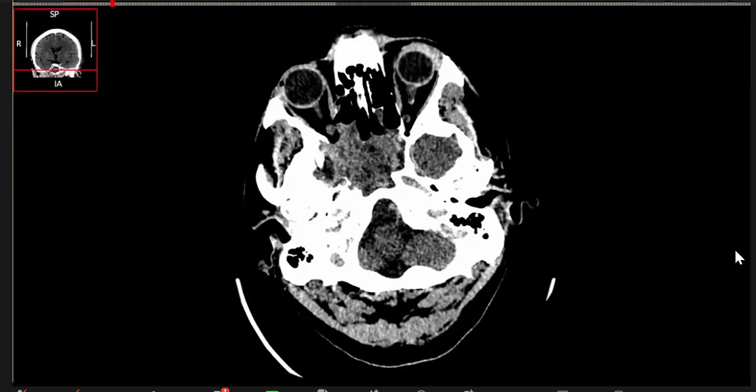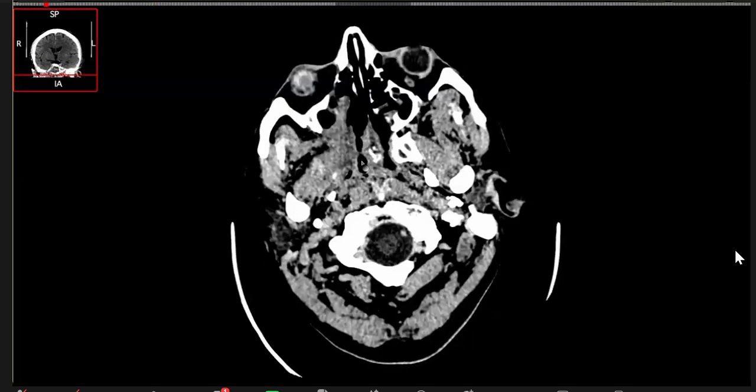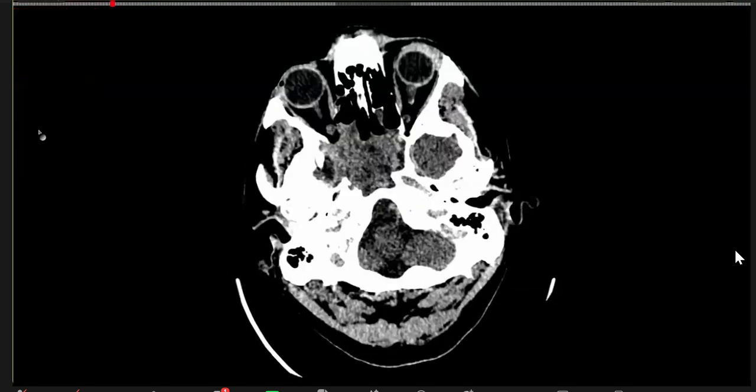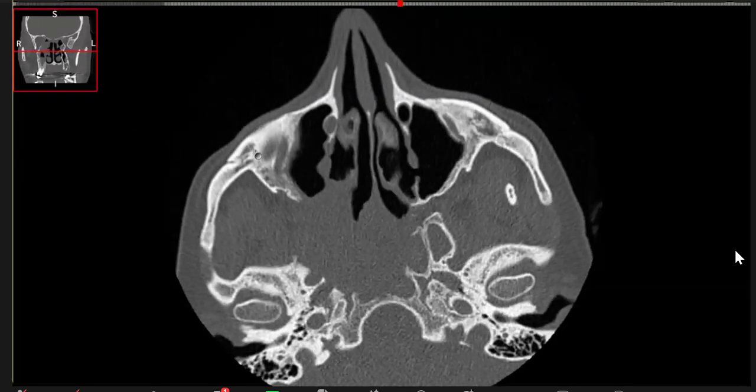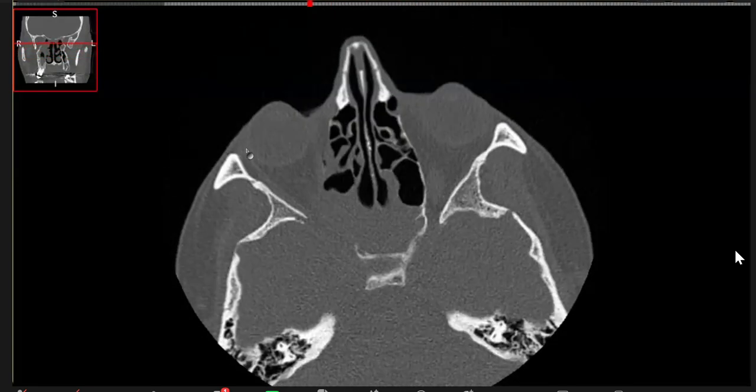There was enhancement in it, so I was not interested in that. My whole interest was the epicenter, and where the lesion is and what the lesion is doing. So let's go back up here.